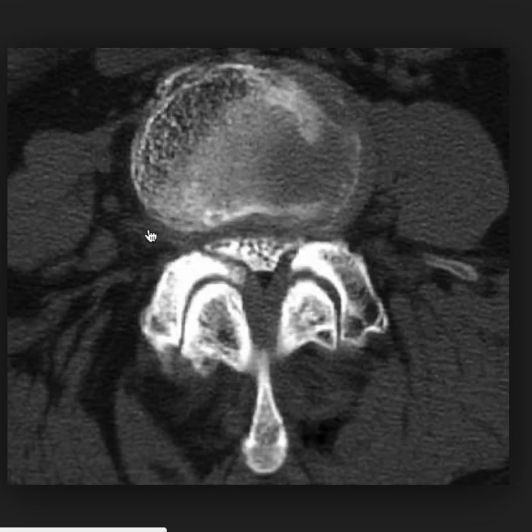And you can see how its margin is very different than the cortical portion of the vertebra. So we're getting compression from the anterior, and we're getting compression from the posterior as well from the increased size, or really because of the pancaking here, the ligaments around this facet joint aren't tight like they should be.